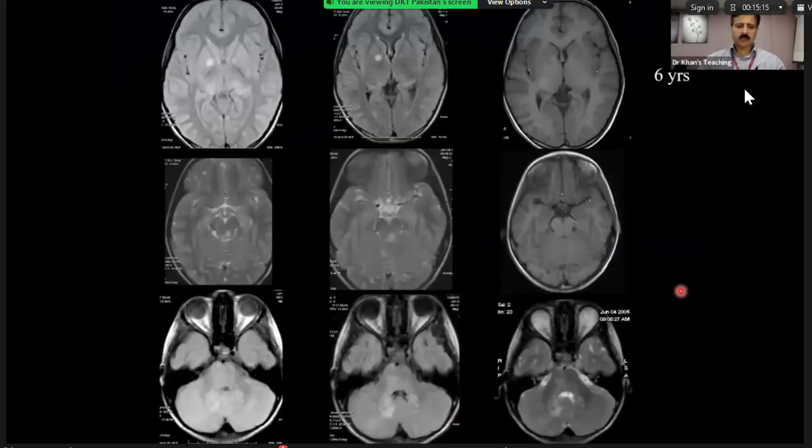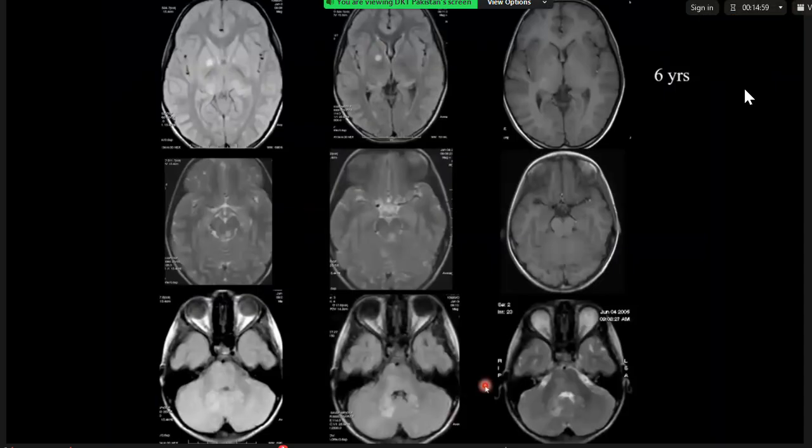Now, this case, what is happening here? The clinical history is that they are worried about NF1. So there are selected axial MR sequences, and the obvious abnormality is high flare intensity foci located in the right lentiform nucleus, in the midbrain and also in the cerebellum bilaterally.